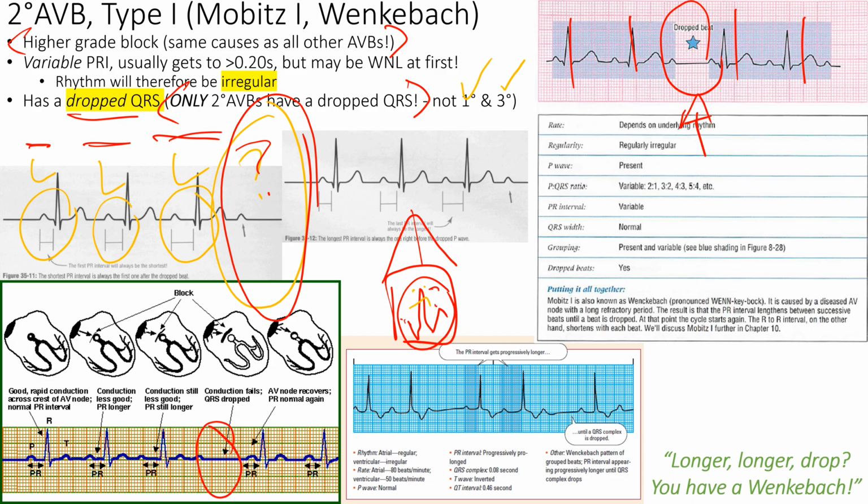Don't get confused, because it's getting a little more hierarchical. Like, second degree type 1, was that first degree? No. The degrees happen first, and then the types happen next. And only the second degrees have types.